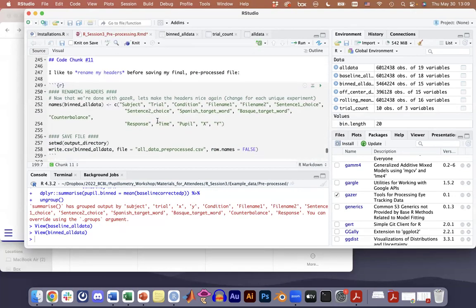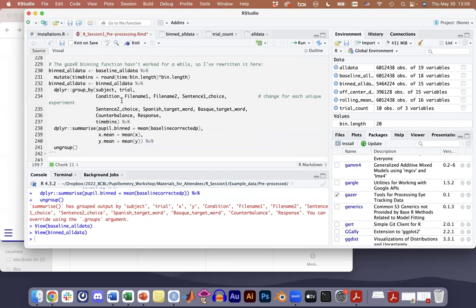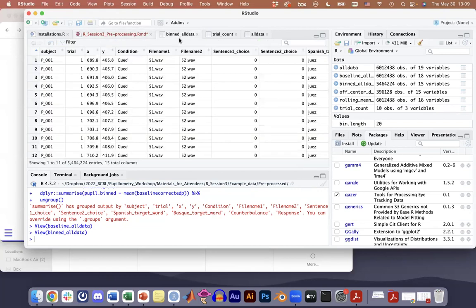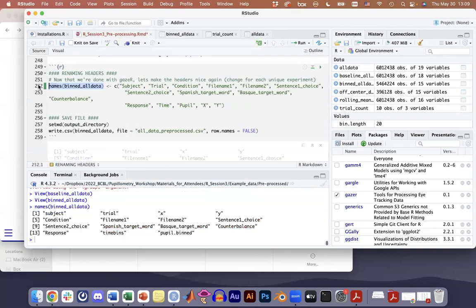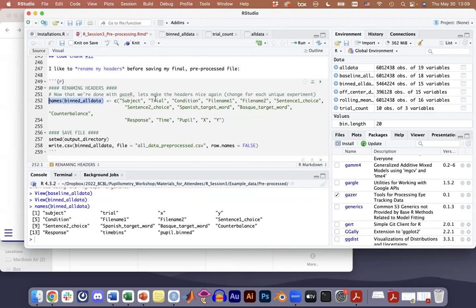That's sort of funny. I'll edit that later. Sorry, let me do a quick sanity check. I have subject, trial.